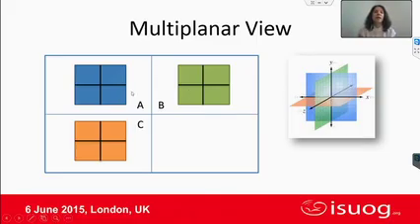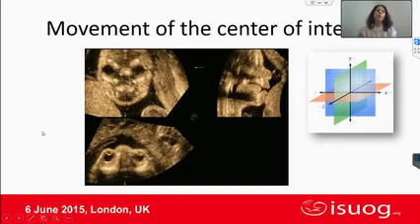Now you can see here all the three planes. The three orthogonal planes are laid out so we can see the information in front of us, although it is taken from three perpendicular angles. And in this case, the point of interest, the dot of interest, is in the center, but it's not necessarily like this. So let's see how it works with a volume.